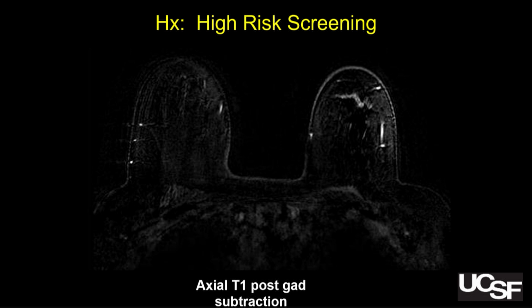This is the same phase, and it's also a subtracted image. It's a T1 postGAD subtraction, and now hopefully you're noticing it's not the most beautiful MR subtraction. There's some artifact. See all the fuzzy lines here? It's not that crisp. So that's the area that I showed you on sagittal earlier, and now you see it in the axial plane. So this is where it is nice to look in multiple planes to determine what is the three-dimensional nature of this thing that I'm looking at. And also, for me, it helps a lot to troubleshoot artifacts and localize.